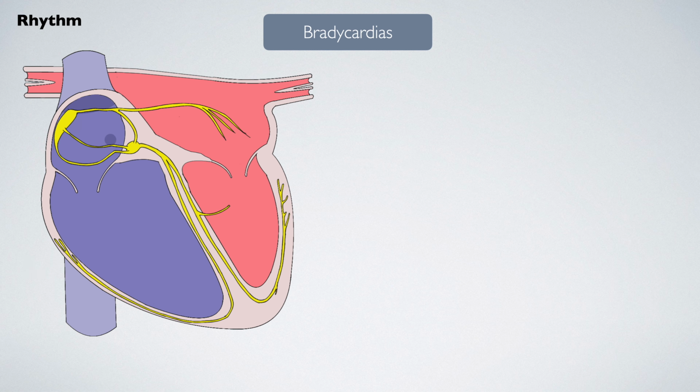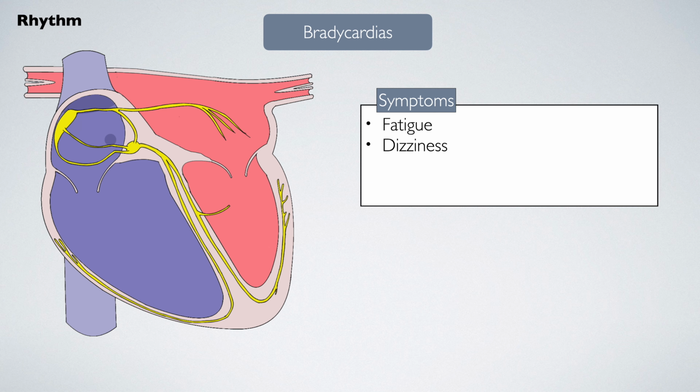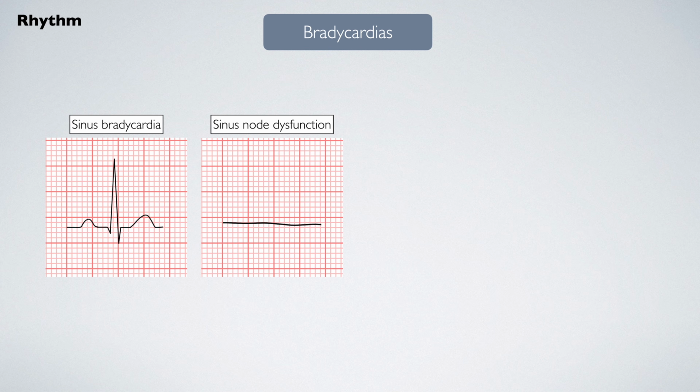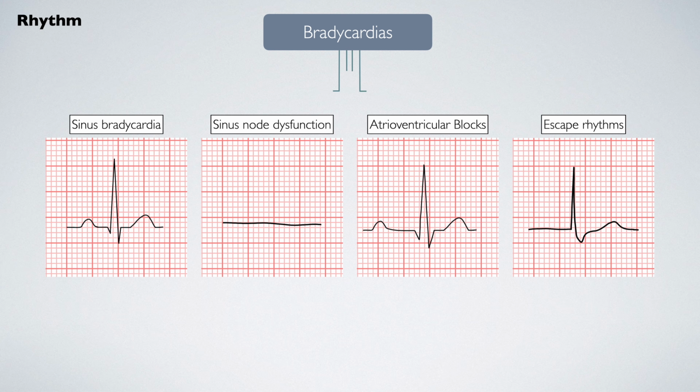In most cases, bradycardias will not cause any significant harm, even when the ventricular rate is in the 40s. However, bradycardia can cause a reduction in cardiac output, and some patients, especially those with existing comorbidities such as heart failure or valvular heart disease, may present with symptoms such as fatigue, dizzy spells, chest pain, syncope, or hemodynamic collapse. Let's take a look at some of these presentations now, and these will include sinus bradycardia, sinus node dysfunction, atrioventricular blocks, and junctional escape rhythms.